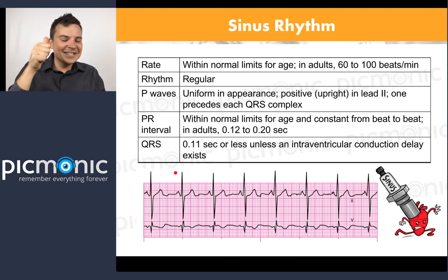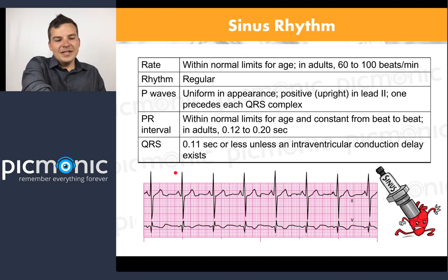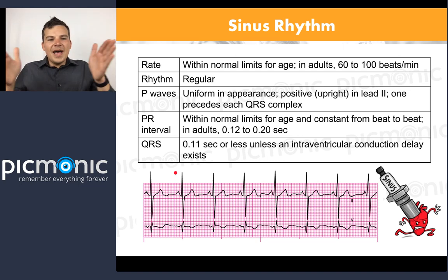So I literally every time, whether it's on an ECG monitor or anything, just thumb it. I take my thumb, put it right up there, angle it to where it's about right, and eyeball it, and I'm like, yep. It's almost the same distance all the way across. There's no wide variations.